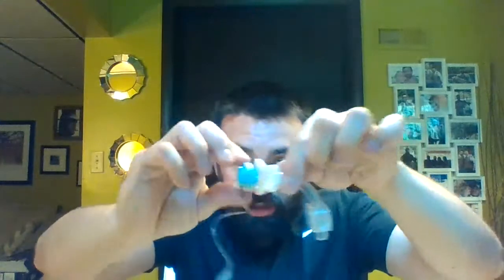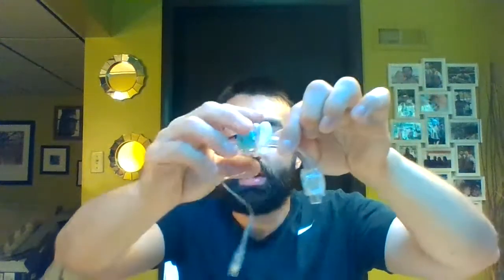Most of the time they're the clip lock, so it clicks in with these 2 little wings right here. But you do have some other Shileys out there, like this is an extra length, so the proximal extra length sticks out a little bit more out of their neck, versus a distal would be a longer one. These particular ones do have a twist lock inner cannula. You push it in, and then this piece twists and locks in here.